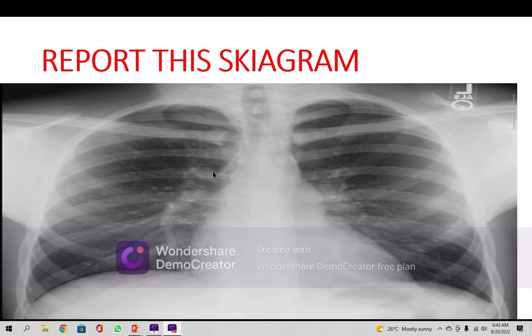The right hilar here is a big one. Because of the bronchovascular marking, the main trunk is this, the upper part is this, the lower part is this. The shape and the size are normal. The left hilar is an inverted C-shape. It is within the normal range. Some calcifications are seen in these hilar, otherwise normal. The hilar is described separately, right hilar and left hilar, always remember.